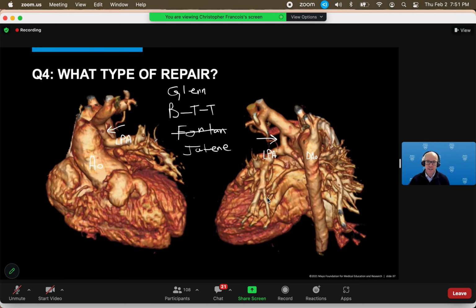And that's the first step in the Norwood procedure, the first step toward what ultimately will become a Fontan or a total cavopulmonary palliation. I'm not going to go over the other ones just yet because we'll see those subsequently.